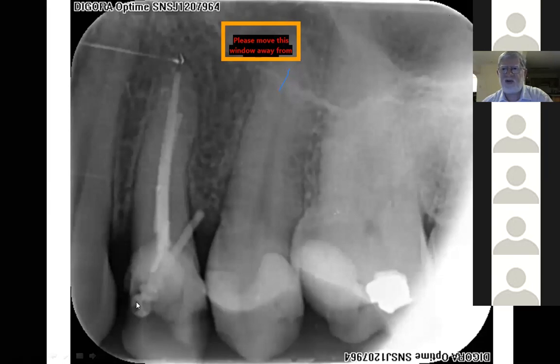Some lovely dentistry here. What is that there? Okay. Looks like a TMS pin brand. And of course, one needs to fix things up there.